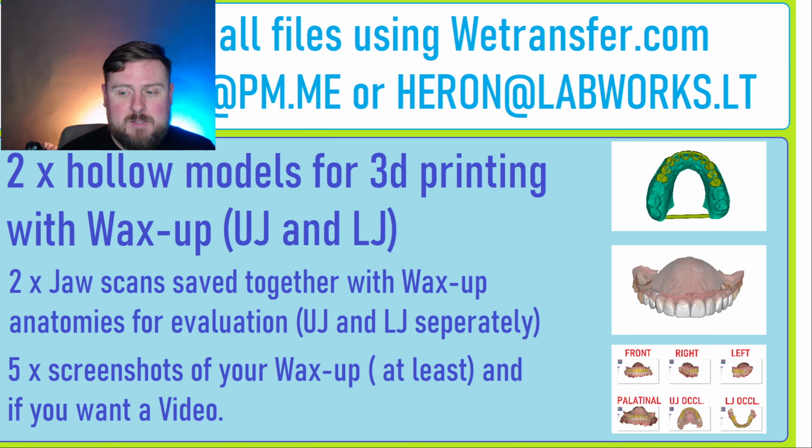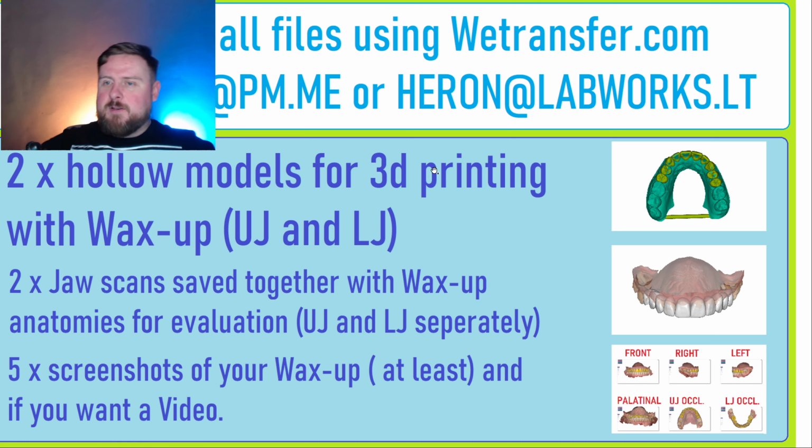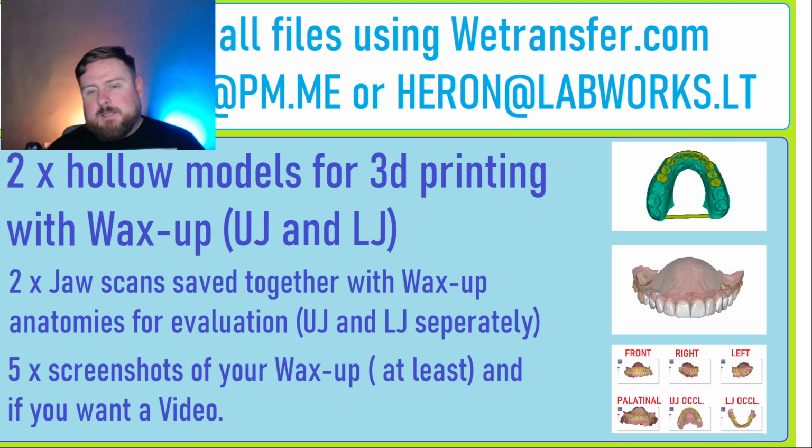So please do not forget to save just a scan file with your anatomies, 2 files, then make 3D printing models and make screenshots as written here. At least 5 screenshots. You can make 10 or 20 screenshots as you like, styled like this, with flying 3D flames and lights and everything very beautiful. You can also make that, but please make at least 5 screenshots by the rules.